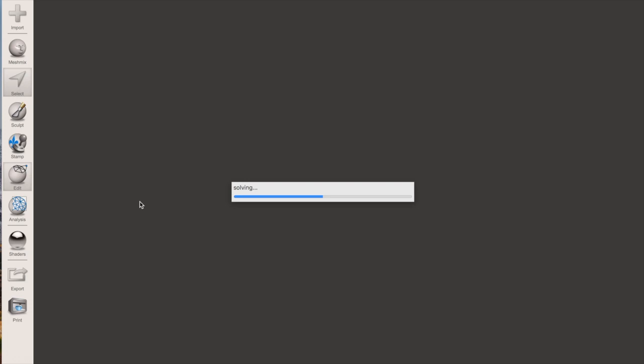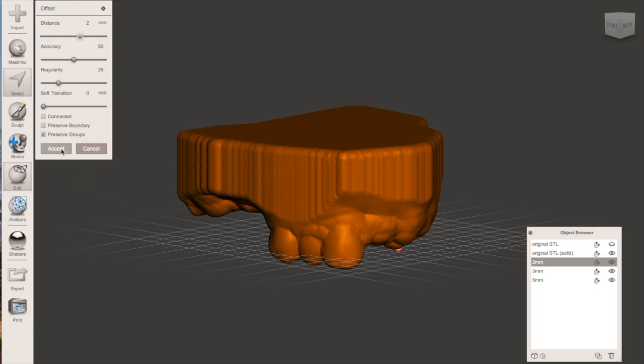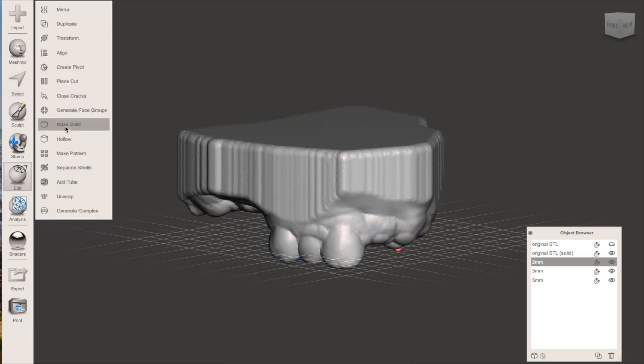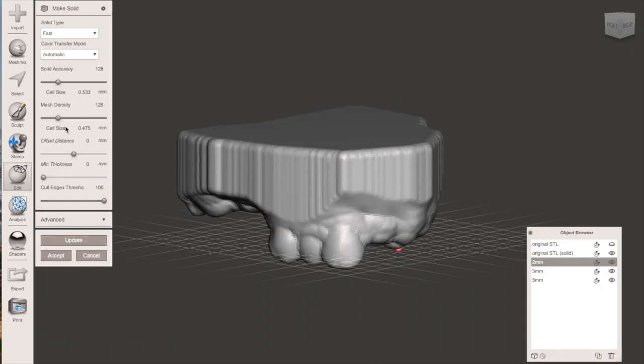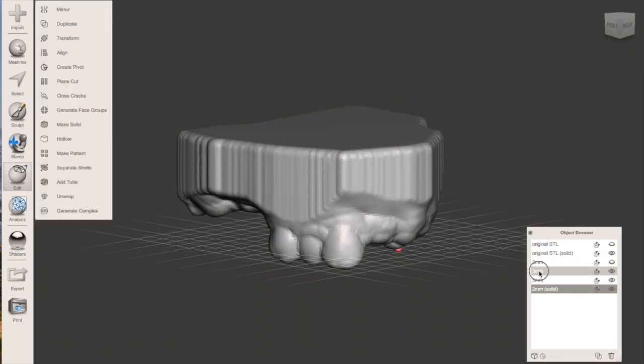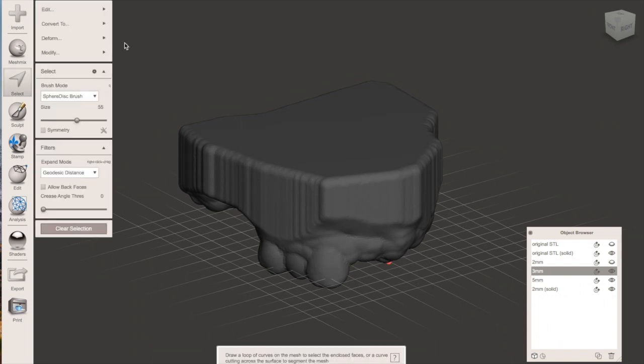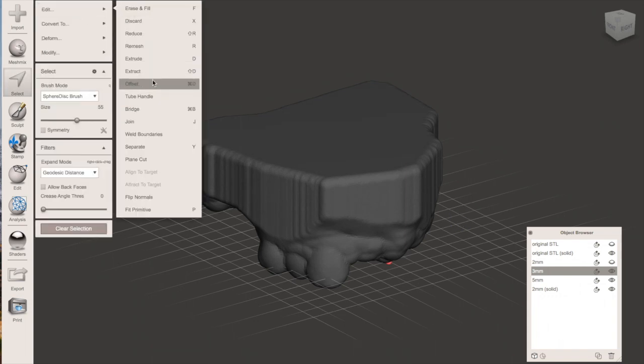The 3mm spacing corresponds to the thickness of the space between the inside of the tray and the mucosa. So if you wanted 3mm of impression material, you'd use a 3mm spacing. If you only want 2mm of impression material, you'd use a 2mm spacing and a 1mm setting to make the rimlock portion, and then 4mm for the external surface of the tray. So here we've got 5mm for the external surface, 3mm for the internal surface, which gives a tray thickness of 2mm. And obviously if you want to increase your tray thickness for whatever reason, you can alter those numbers to fit.